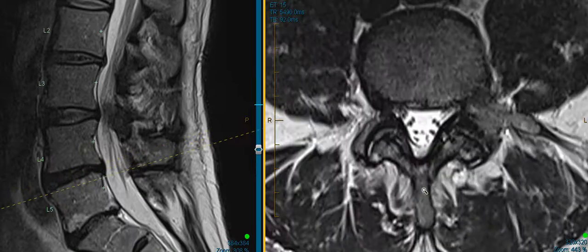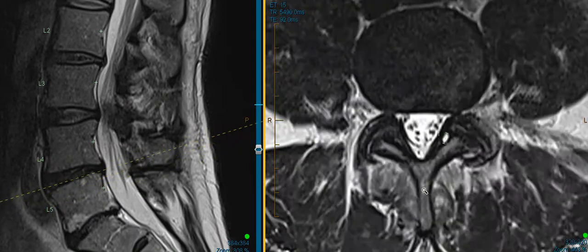This is the top-down view on the right side, and if you've watched my How to Read Your MRI video, you'll be familiar with this. If you haven't watched it, take a peek at it. This is a pretty normal-looking spinal canal right here. This whitish triangular region, these little black dots are the nerve roots. That's the disc right there. When we have stenosis, we have narrowing of this space.